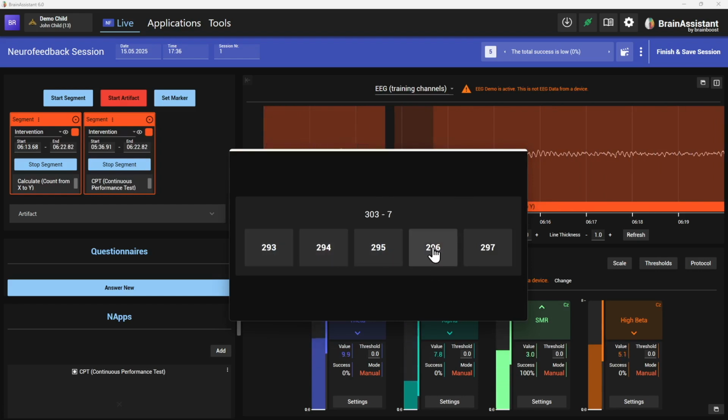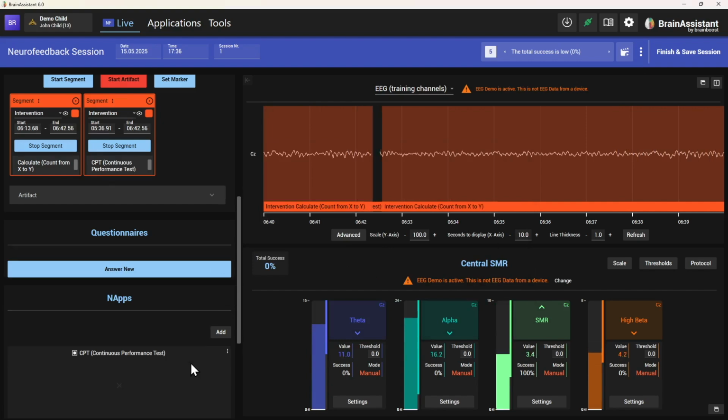So it would be this one. And then the task disappears. It's always minus 7, every time minus 7. If I press the wrong answer, it will help me. If I then press the right answer, it will not help me until I make a mistake. Then it will help me again. So what can you change? And I will show you.